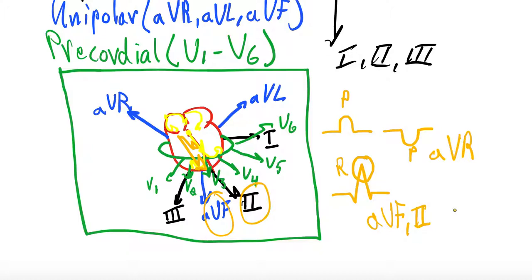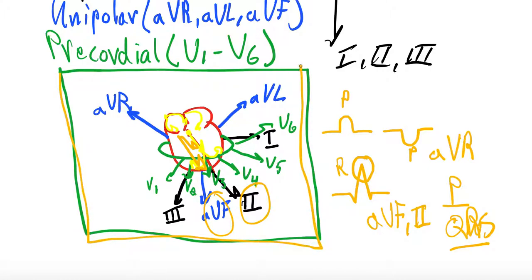Look at a 12 lead EKG and kind of mentally go through in your mind the P waves, the QRS in each lead, and then correlate that back to this drawing, because I think what you will find is that this anatomically and geometrically makes sense in terms of the depolarizations, the directions they're going, and then whether the waves are upright or downright.